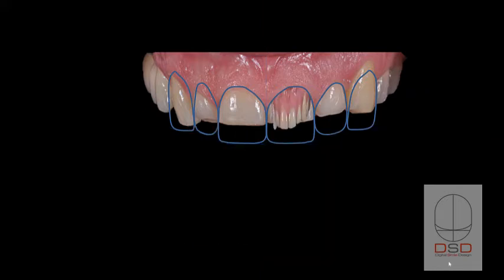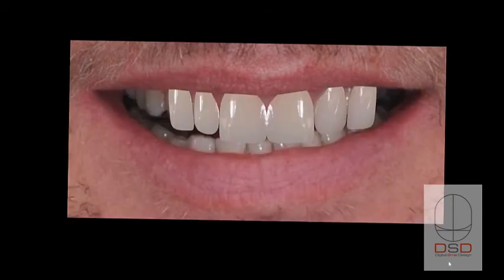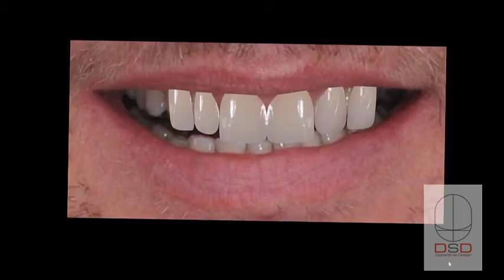So now we add the image to the clipboard by Ctrl+C, and then we click on tooth 21, and we select to do an image filling. Then we can just stretch this image by working on the crop on the little circles, and we can do this for the whole teeth. We can now bring the lip, make the design of the lip, bring it over the teeth, and also we can play with the transparency. At the end, this image has the whole face around it, as shown before.